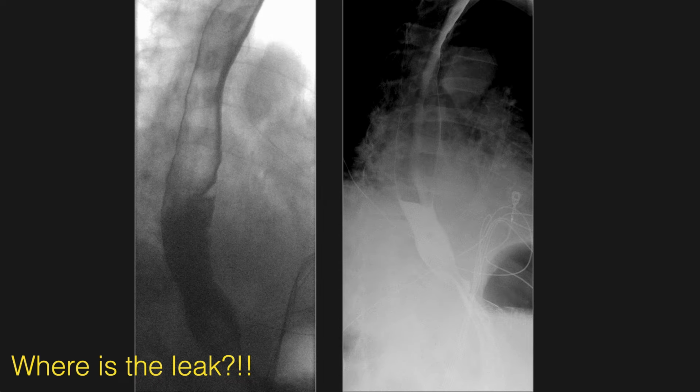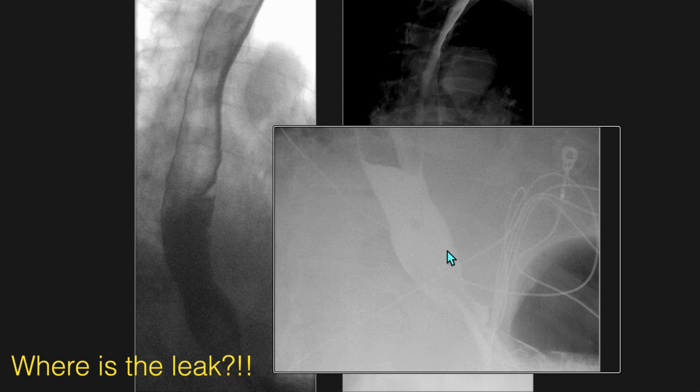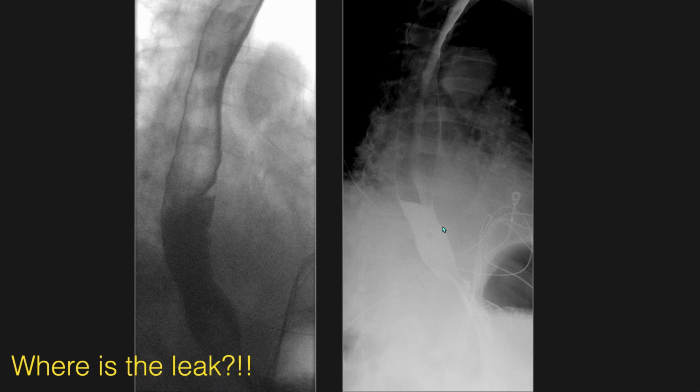So I took the patient back to the fluoroscopy suite, but for the life of me, I could not find the injury. This picture may overall feel familiar to you: a larger patient, poor penetration of x-rays, and challenging positioning, limiting the sensitivity of the exam.